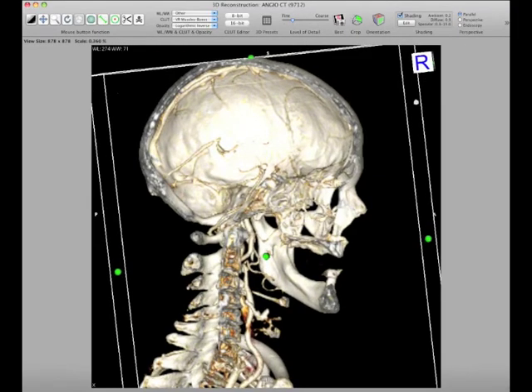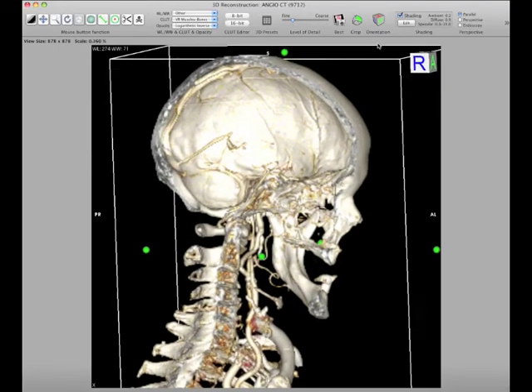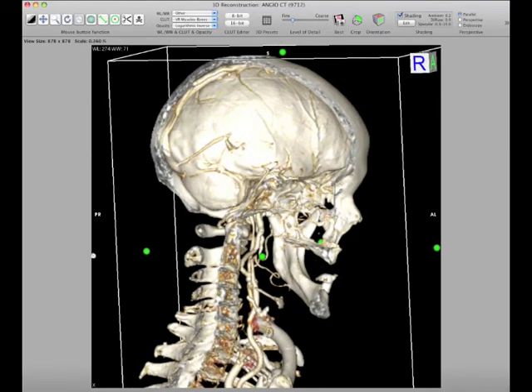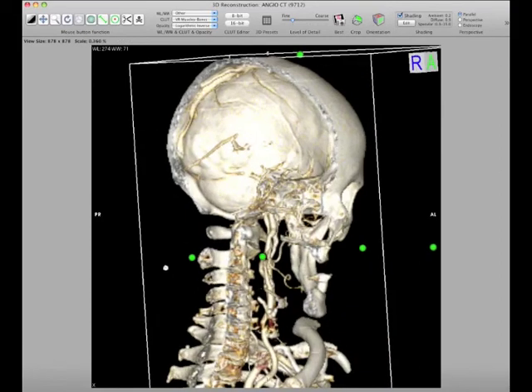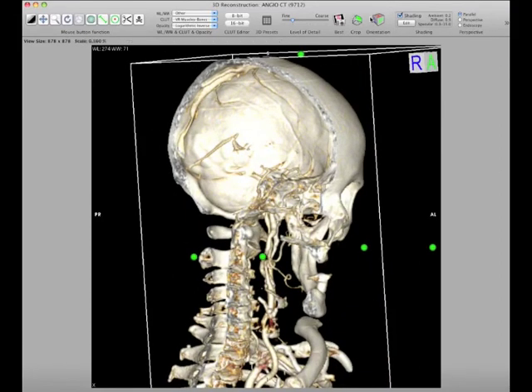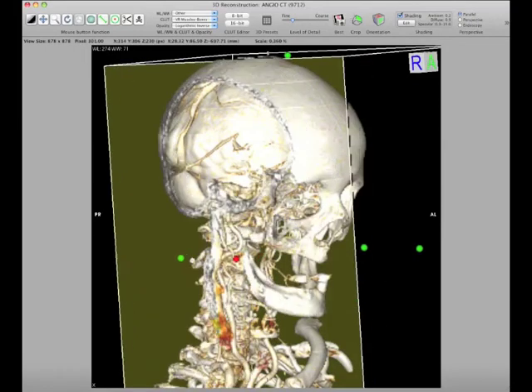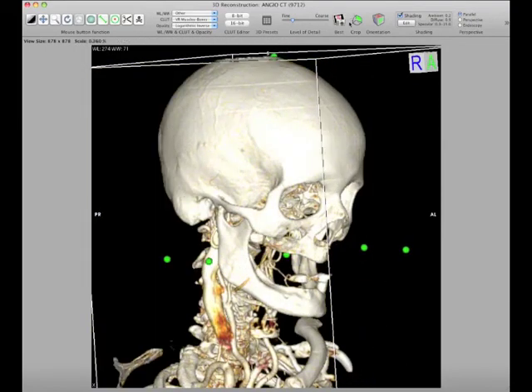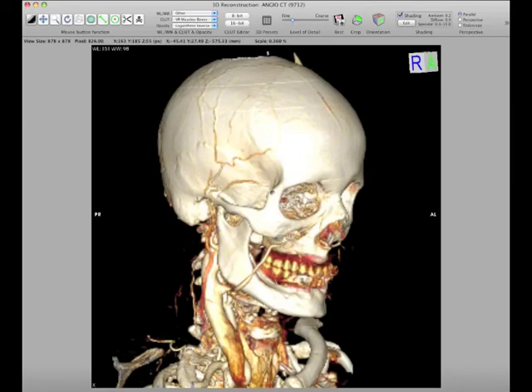All right. And again, what you could do is you could position the box like this. Let's say we have something like this, and we need to see inside the vertebral canal. So we would make a screen grab of this. First, click the crop tool to make it disappear. Make a screen grab by hitting Command-Shift-3. Bring the crop tool back to expose the entire skull. Command-Shift-3. Get the window leveling tool.